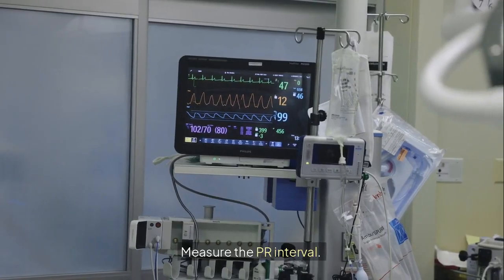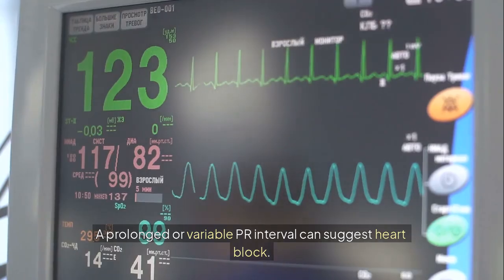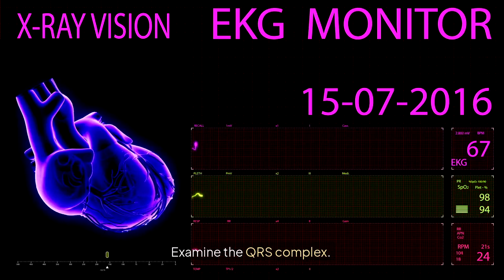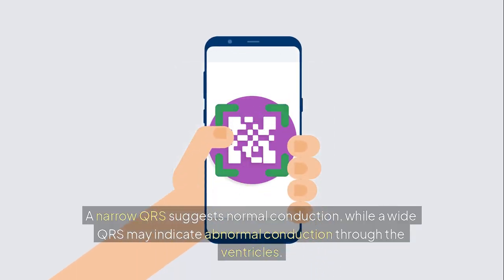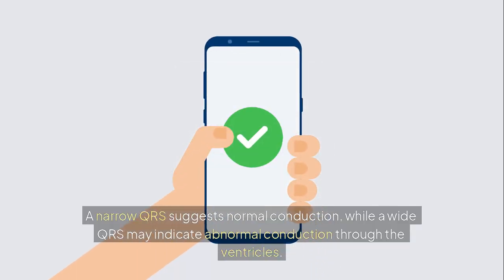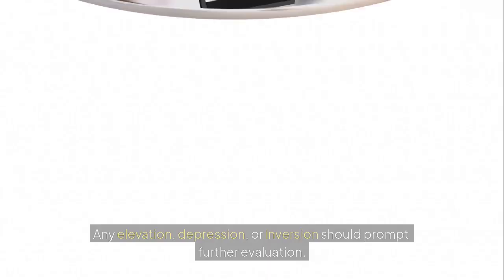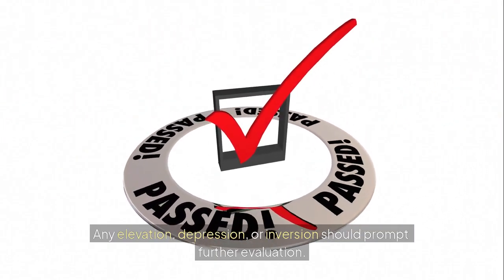Measure the PR interval. Is it normal and consistent? A prolonged or variable PR interval can suggest heart block. Examine the QRS complex. Is it narrow or wide? A narrow QRS suggests normal conduction, while a wide QRS may indicate abnormal conduction through the ventricles. Inspect the ST segment and T waves. Any elevation, depression, or inversion should prompt further evaluation.